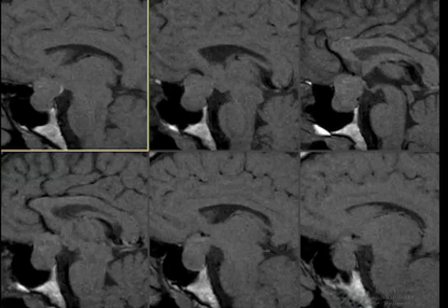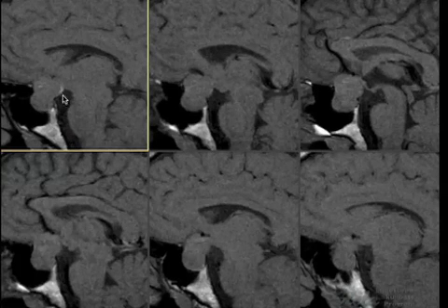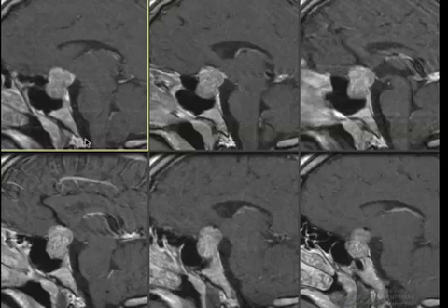Okay, so this is the MRI showing sagittal imaging showing an apparently very large mass involving the entire sella and then extending into the suprasellar cistern. You can see the small hyperintense signal right here, and this may be the residual posterior pituitary. So I'm thinking this is where the normal pituitary tissue is.